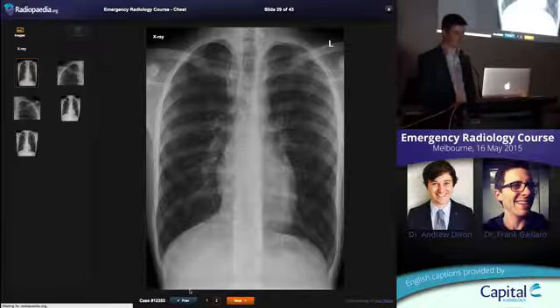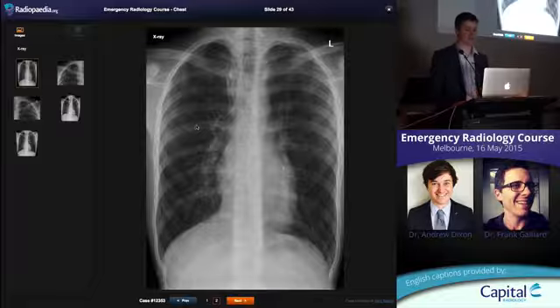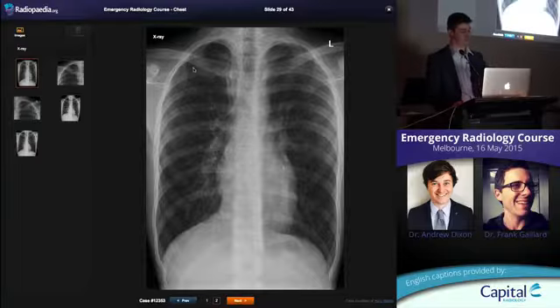17-year-old male with chest pain. This is the more standard kind of thing you're going to get for a pneumothorax, one that's not in tension, and you're trying to identify, have they got one, have they not got one. The key is obviously in an erect patient to be looking up the top. The air is going to sit up the top of the chest.